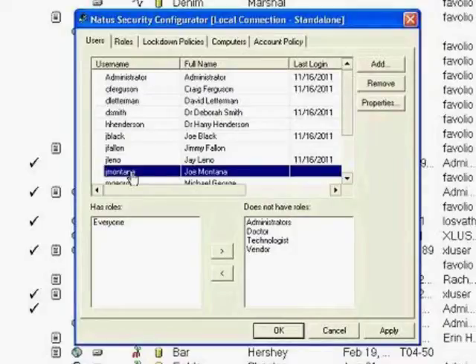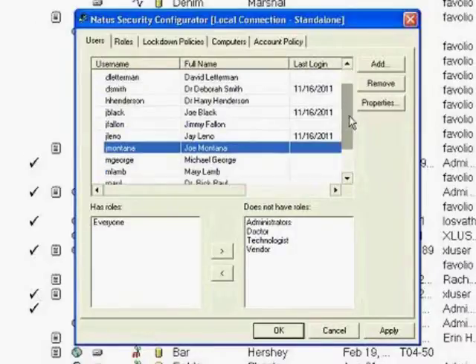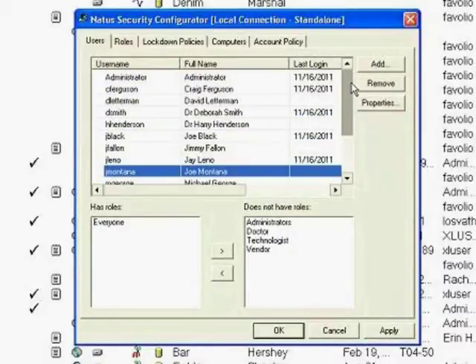If I created these rules individually for Joe Montana, let's look at the number of users we've got here. It's about 15 or so users. Imagine if you had 30 users or 40 users or 50 users. So one way, if we're just thinking about this logically, is that we could go into each person's profile and possibly create individual rules for all of them. Again, we're just talking theoretically and logically about how one might approach creating permissions for a user.